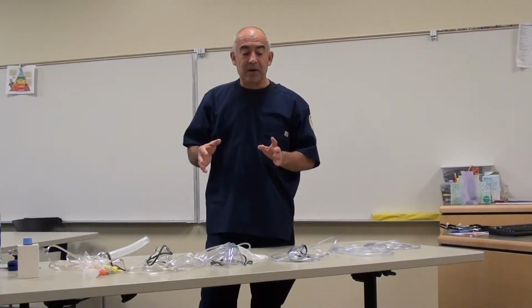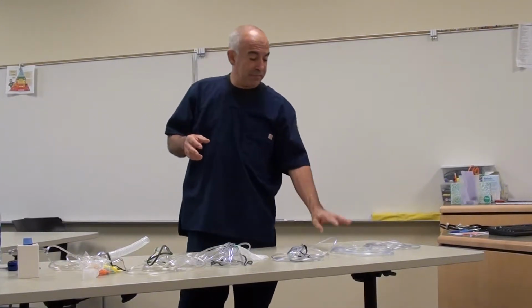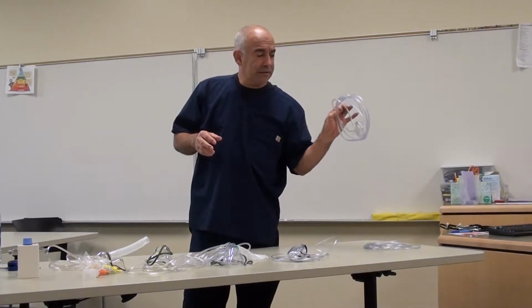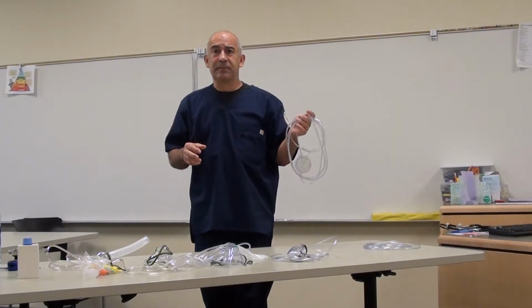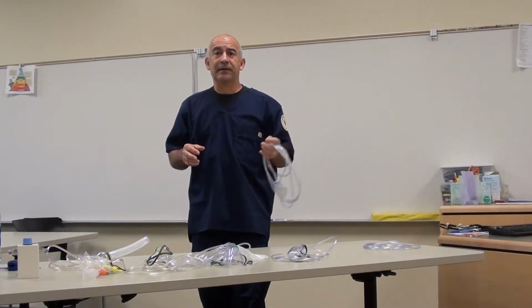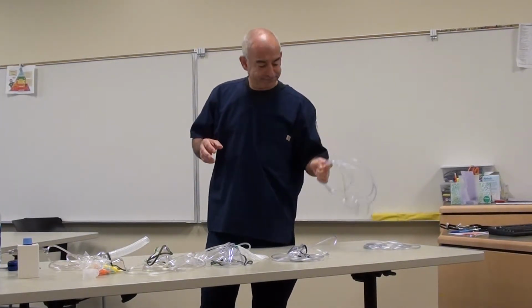Next I want to talk about the reservoir bag devices. So, before I move on, I want to make sure everybody knows that this also is good for home patients and ambulatory patients that are looking for more mobility.